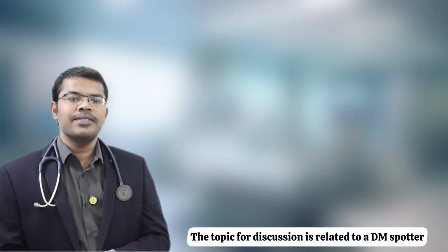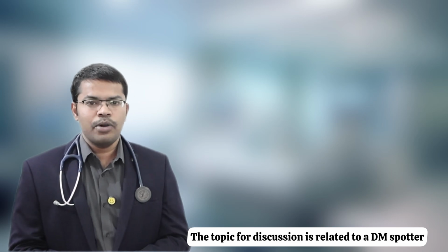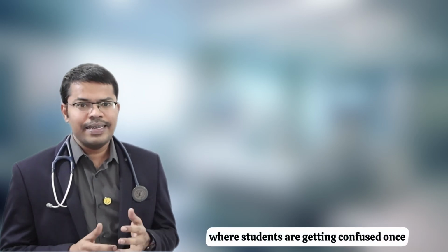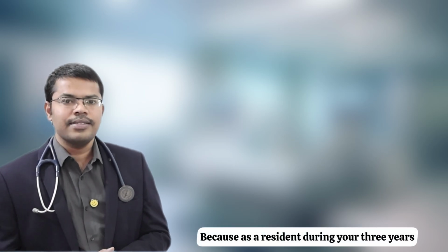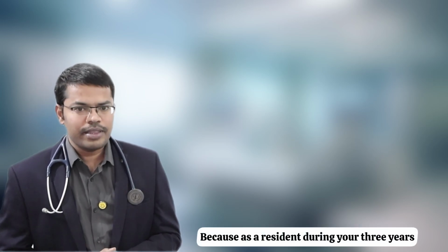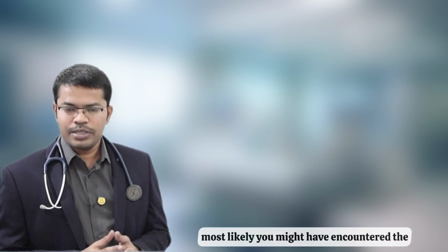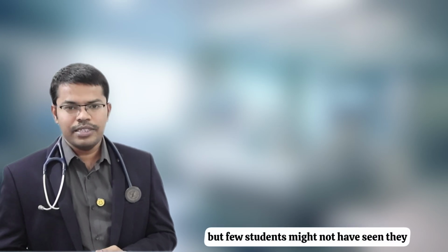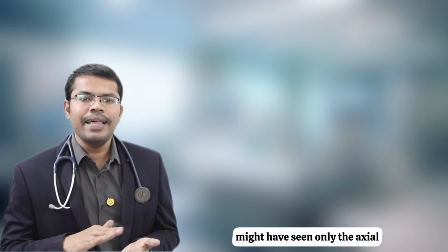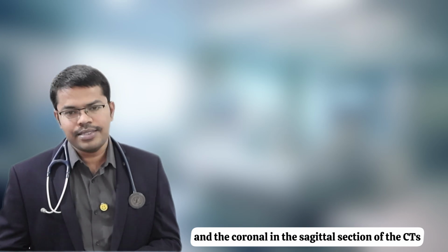The topic for discussion is related to a DM spotter or DNB nephrology spotter, where students are getting confused once they are seeing this kind of images. Because as a resident during your 3 years, most likely you might have encountered the 3D VR images of the CT. But few students might not have seen, they might have seen only the axial and the coronal and the sagittal section of the CTs.